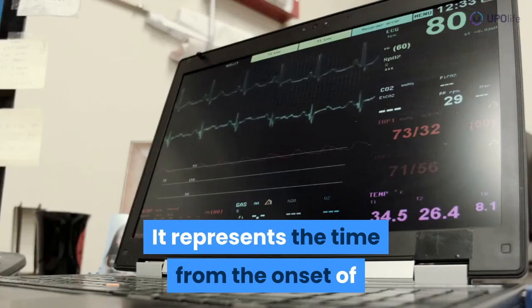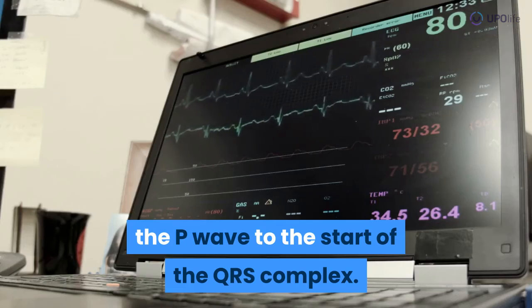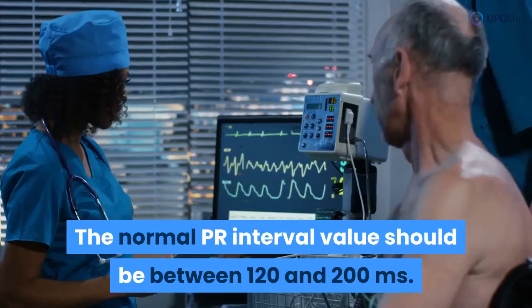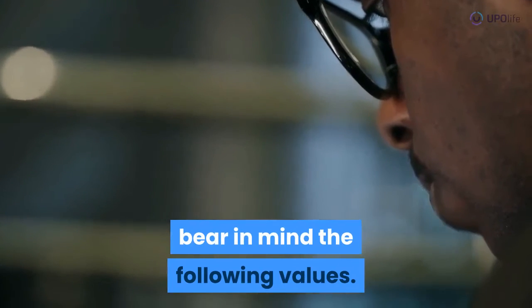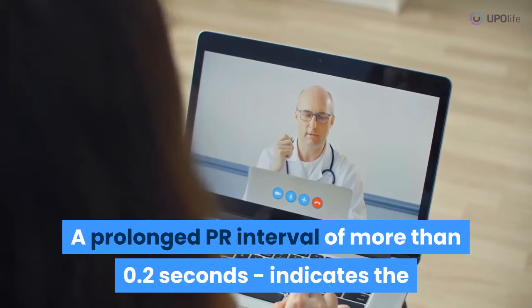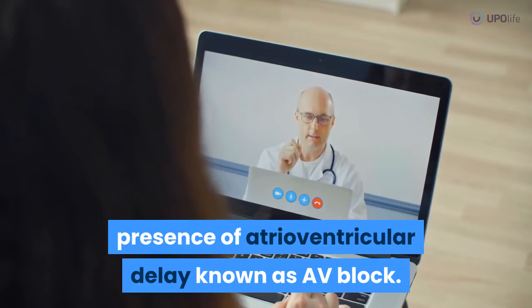The PR interval is measured in units of time. It represents the time from the onset of the P wave to the start of the QRS complex. The normal PR interval value should be between 120 and 200 ms. When analyzing the PR interval, you need to bear in mind the following values. A prolonged PR interval of more than 0.2 seconds indicates the presence of atrioventricular delay known as AV block.